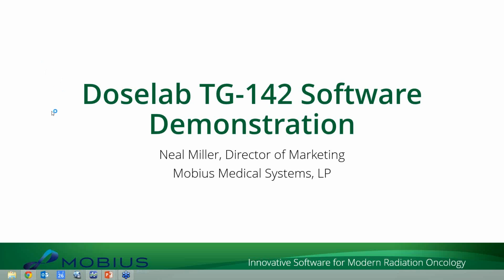There we go. So I'm going to be talking about DoseLab TG-142 software today and doing a demo of the software. I want to remind people that you're all muted, so you can't talk to me.